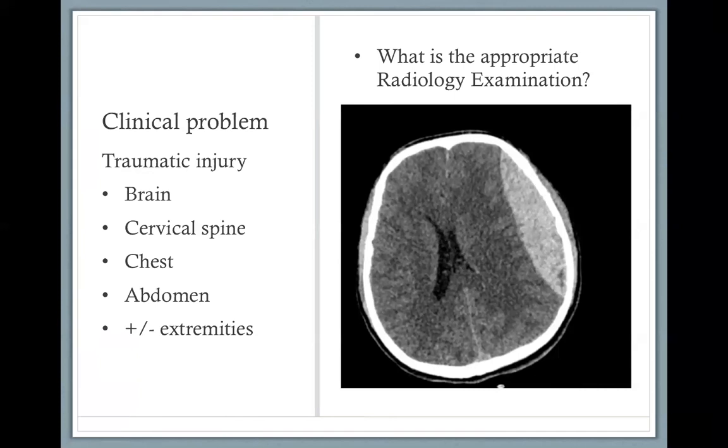It expands very quickly because it's often arterial. And it takes place in a very tight space. So it actually causes lots of mass effect on the brain. And this is why it's very dangerous and needs to be evacuated very quickly. We know it is so because it's lentiform. So usually they have this lens-shaped appearance. And at the same time, they don't cross the sutures because this is how the dura is attached. So this is an epidural hematoma, needs evacuation.